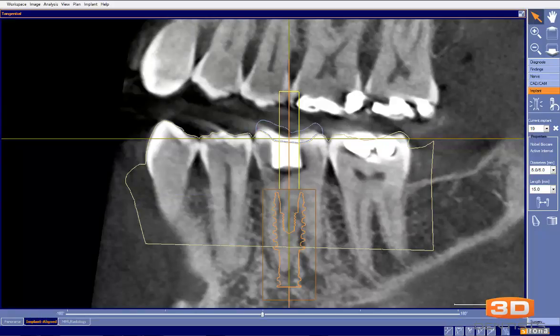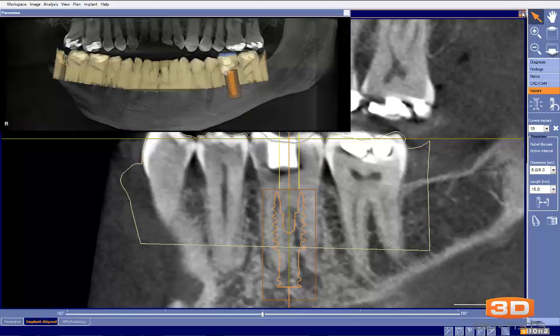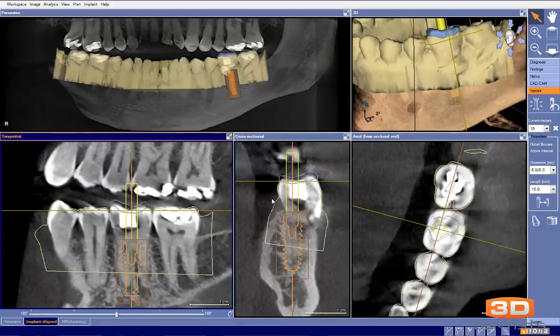The way I visualize this is I visualize my root here, and that's the distance. In an ideal starting point world, I'd want this a little bit more centered. So if anything, I'd say we need to have it a little bit more right here. Again, these are starting points, and then we adjust as we move forward in our plan. Next level is bone level.